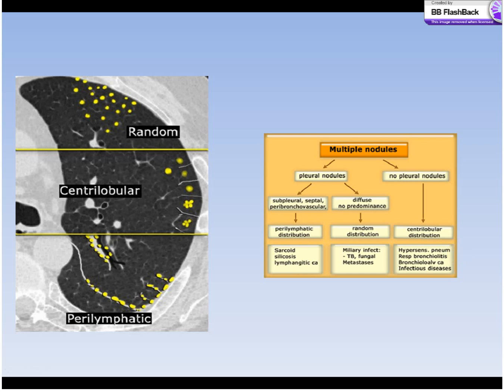HP, abbreviated, is usually a reaction, an immunological, inflammatory, or allergic reaction of the lung to an inhalant, to an antigen of some sort that needs to be breathed in, and that's why at the beginning of this disease you see nodules in the central areas of the secondary lobules.